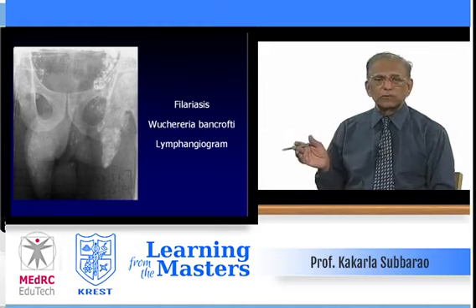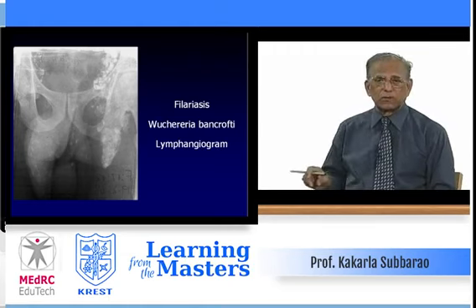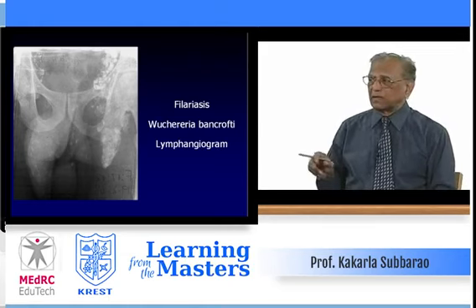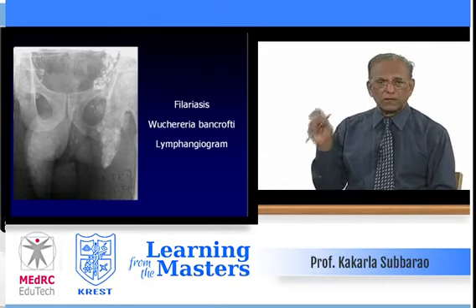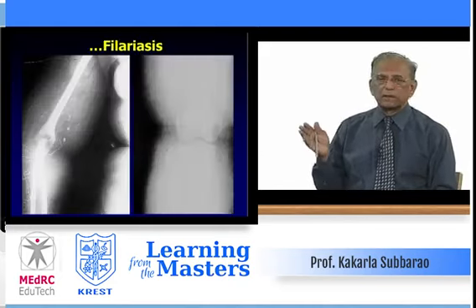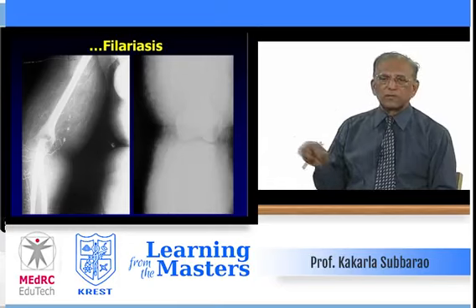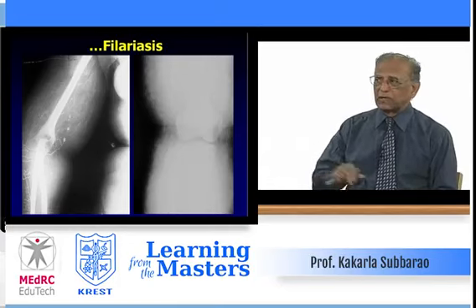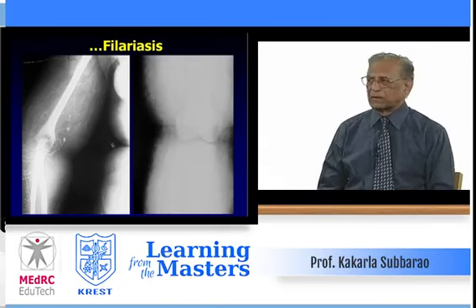And how does it produce soft tissue swellings? Bone infection, not necessarily, unless there is a secondary infection. Bone is not involved by filariasis. But lymphedema, and with lymphangiograms, enlarged lymph nodes with obstruction to the lymphatics. Same thing in the arm, it can occur in the knee. Diffuse soft tissue swelling is important. With the lymphangiogram, you can outline the obstruction of the lymphatics with these filarial organisms.